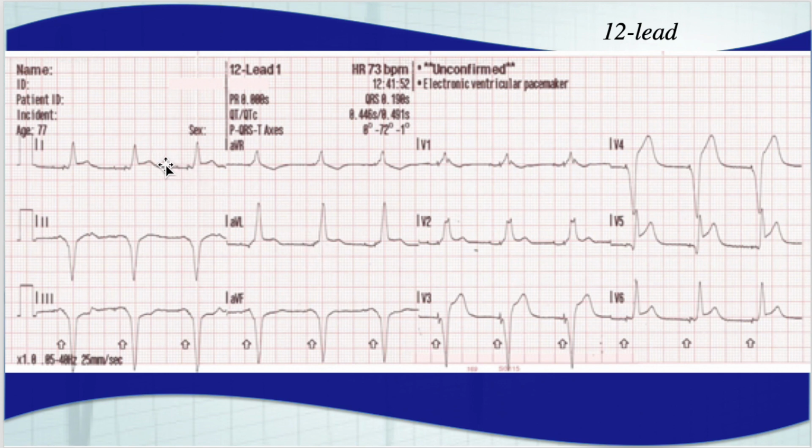just like the last 12 lead we were looking at, you do have some concordant elevation. All right, you have some concordant elevation in 1 and AVL. Those are both leads where you have a terminal R wave, so it's positive with elevation. And over here in V1, V2, we don't have a left bundle branch block pattern, but again, it's a ventricular pacer, so we're still using the same rules. We may see here in V3 about 5 millimeters of elevation. Maybe it's just under 5 millimeters, so let's not even count that one. Let's just go with the concordant changes.